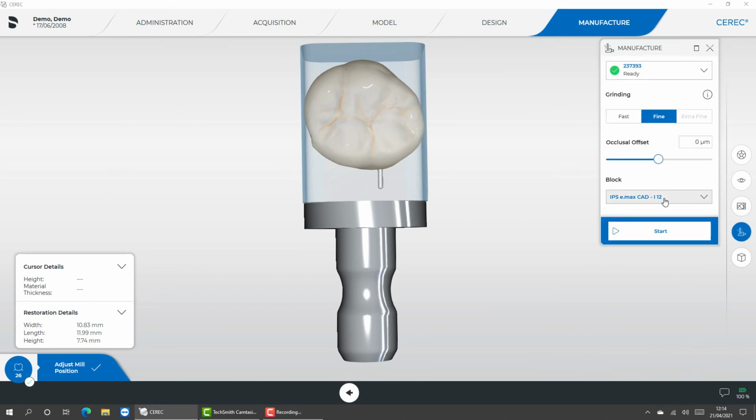I've now actually turned on the CEREC milling unit, and as you can see here, we've chosen an IPS Emax, Ivoclar Emax crown. It's a size 12 that we can change to the block size that we're going to use, and again, you're just going to select the block size that A, fits your restoration, and B, that you have in your drawer. Again, you can see here there's various items that we can play with and adjust, and again we'll talk about those in due course.